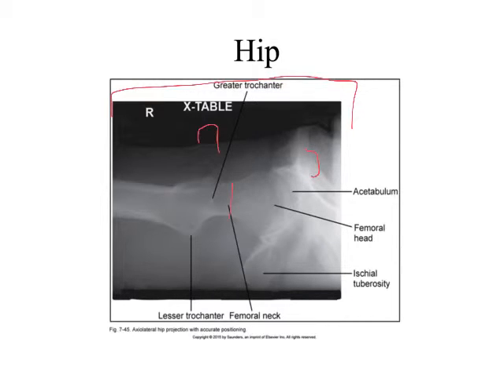What have we centered on in this image? Right, the femoral neck. That's what we want to see in the middle of this picture. Is that easy to do? No. So honestly, that's probably the first two things we're going to ask when we look at this picture, directly related to our discussion. How's the technique? Did we center appropriately? I used to think that we were supposed to be centered up here when I shot these images. And I realized that's simply not the case.